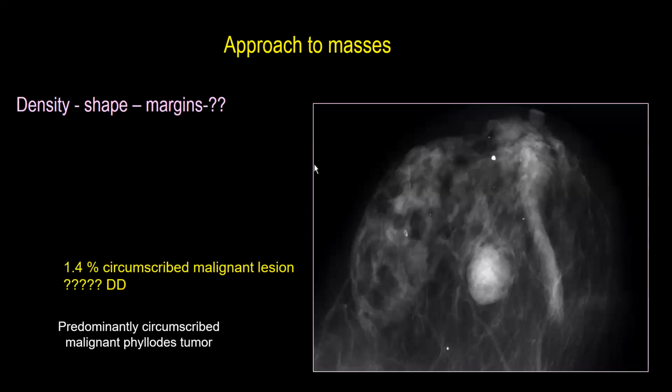That is why we have to be cautious when we categorize a mammographic mass, and why now they concentrate on the density of the mass. It is very unlikely for such a mass to be of lower density. And we also have to consider if the mass is palpable.